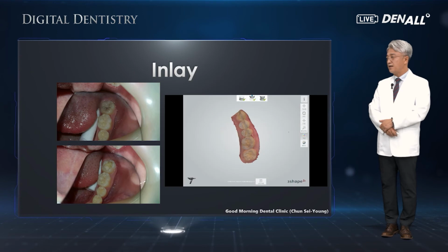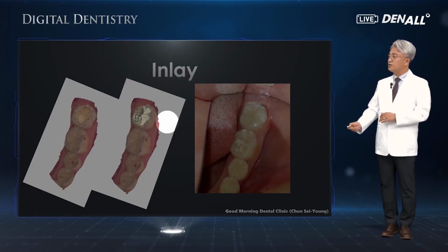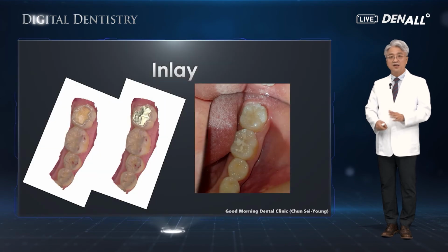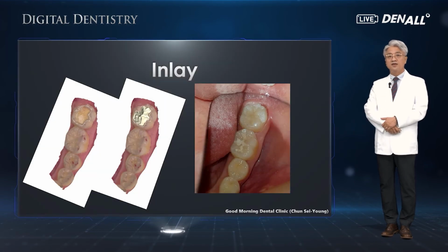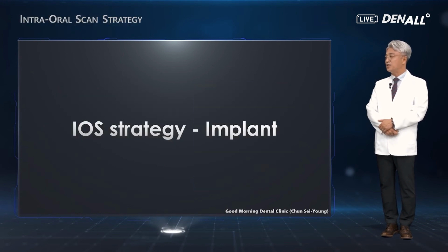You could do it very simply. This is the prosthesis design already done. It is delivered to a patient. When you adjust the setting values, you will be able to realize the prosthesis can be very precise using this way.